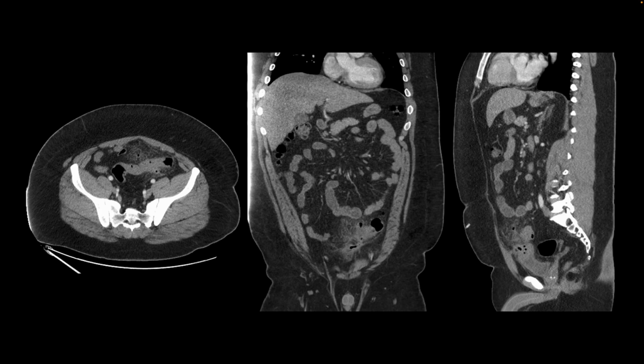This is our next patient. They presented with left lower quadrant abdominal pain, and the findings are classic. We see some diverticulosis, and around the colon, here's a sigmoid colon going that way. We see focal free air and surrounding fat stranding. So they have contained perforation from diverticulitis.